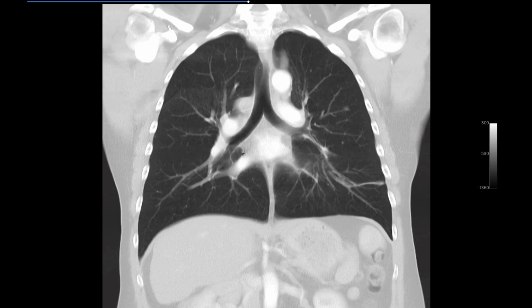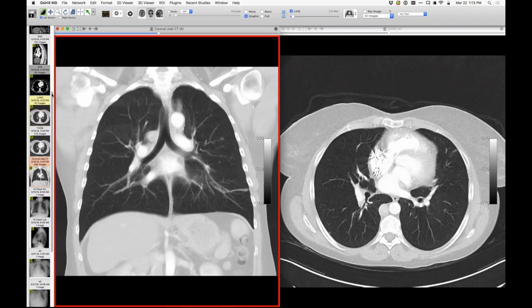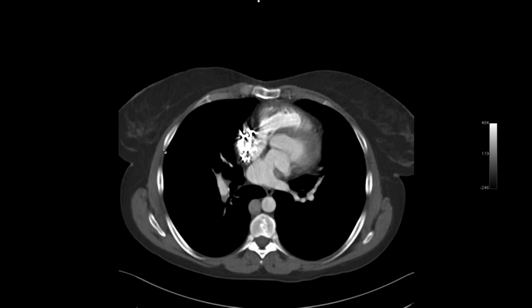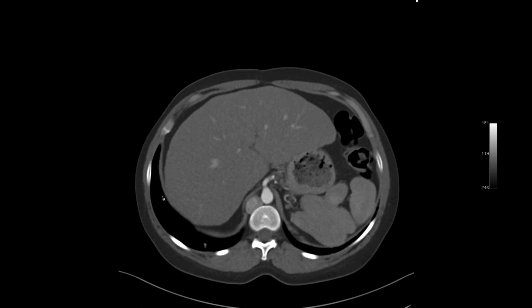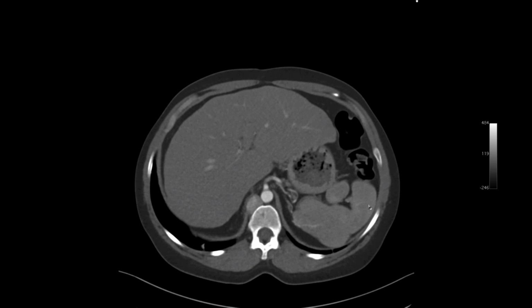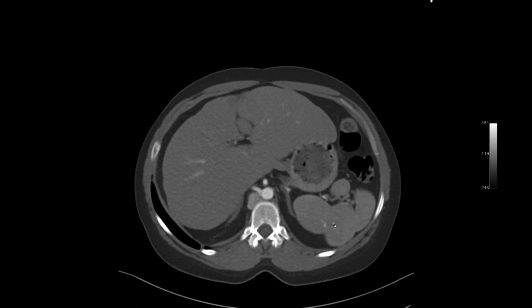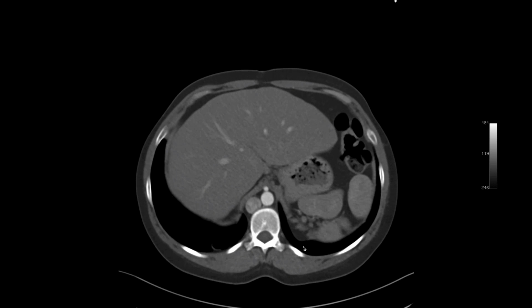Howard, was there polysplenia? Pardon? Was there polysplenia with the? You know, the spleen, I'll go back to that because the spleen looks odd. But I don't think the spleen has separate spleens. It's just like this very strangely shaped lobulated spleen that almost looks like polysplenia, but it all seems to connect. And there is an association between hyparterial bronchi, bilateral, and polysplenia, but polysplenia usually is on the right side, right? So I looked at that and I thought, well, there's polysplenia, but then they aren't entirely separate, right?